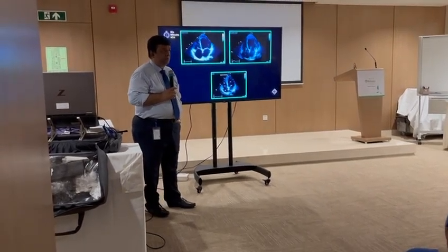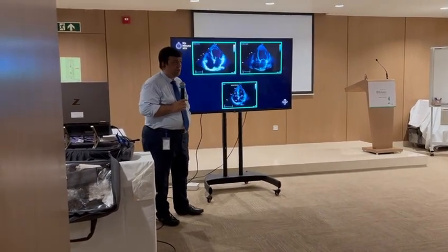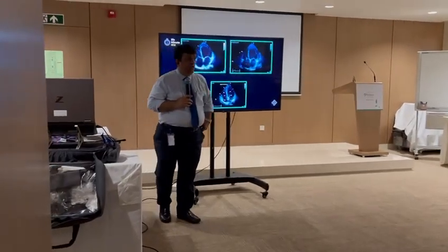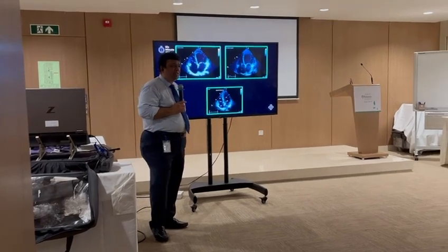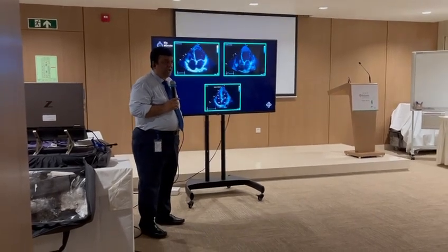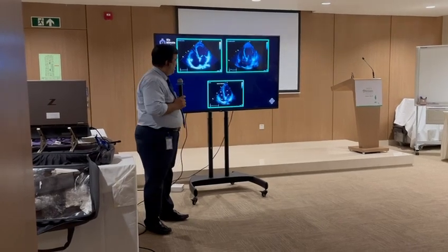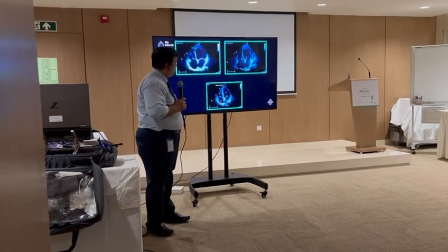RA has some, maybe central line. RA. Okay, so one could be central line, you are right. This is a catheter here. What else could this be? More likely with this LV function. Pacing. So this is a pacing lead. I know that because we've done the echo myself. So it's a pacing lead. In fact, it's a defibrillator. It's an AICD with a pacing with a defibrillator.